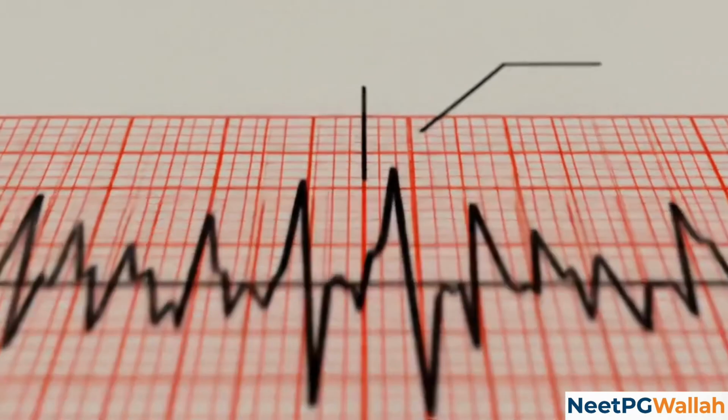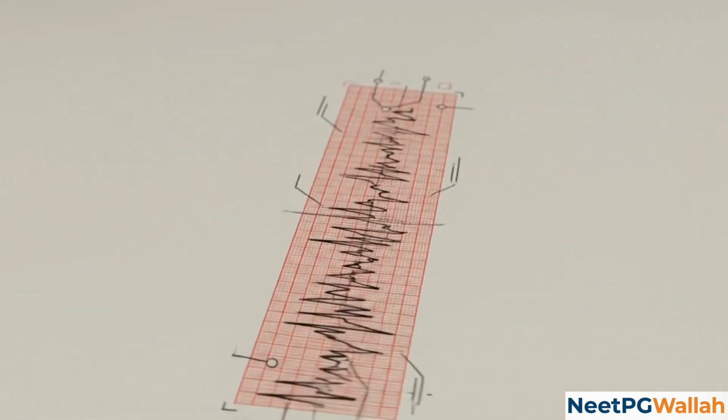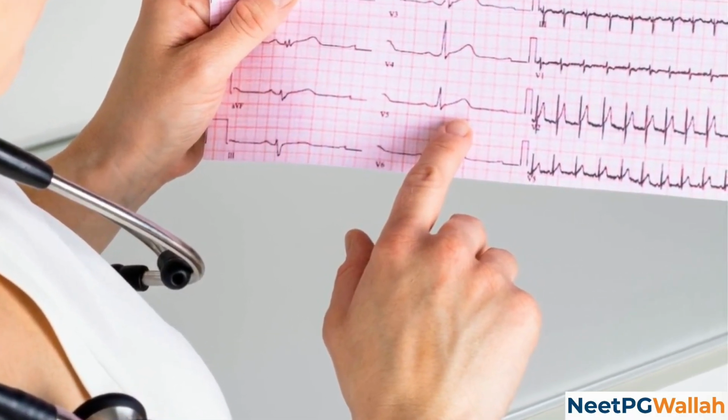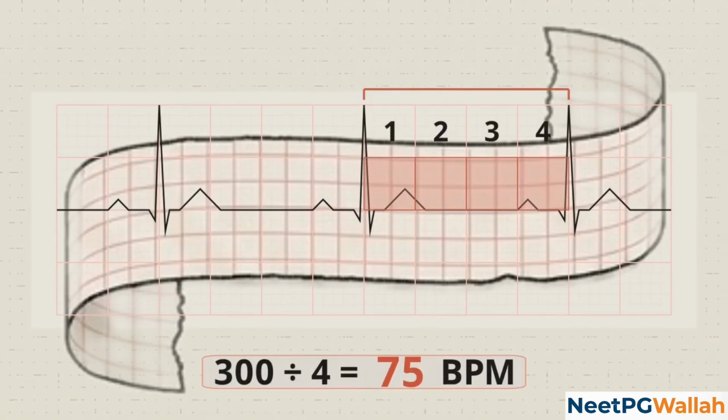By zooming out, the 6-second method accounts for the localized gaps and provides a mathematically sound average for an erratic heart. We can apply this entire process to the strip in this doctor's hands. The gaps between the spikes are identical, confirming a regular rhythm. Counting the large boxes between beats shows 4 squares. 300 divided by 4 gives us an immediate rate of 75 beats per minute.